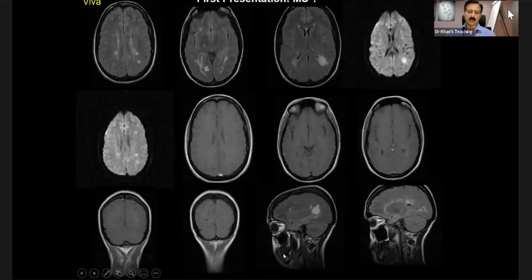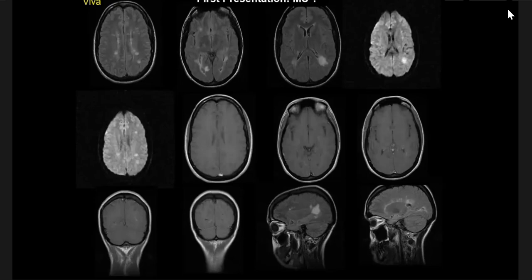Can you diagnose it as MS? Confirm it. First presentation. I don't think there's enough information.